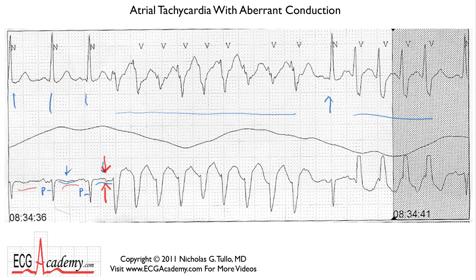So if there is a P wave and it's premature, because obviously the next sinus beat would have occurred somewhere here, this is a PAC, and the QRS complex that follows that PAC has a fairly normal PR interval, a little bit longer, in fact, I think, than the intrinsic PR interval. And that's because it's a premature beat that encountered a little bit of delay in the AV node. You have this wide QRS complex that occurred because of a functional bundle branch block. And let's assume that this is V1, it kind of sort of has this left bundle branch block looking pattern with a deep QS kind of appearance to it.